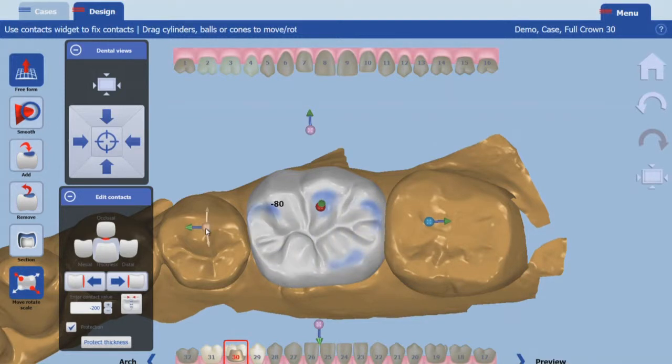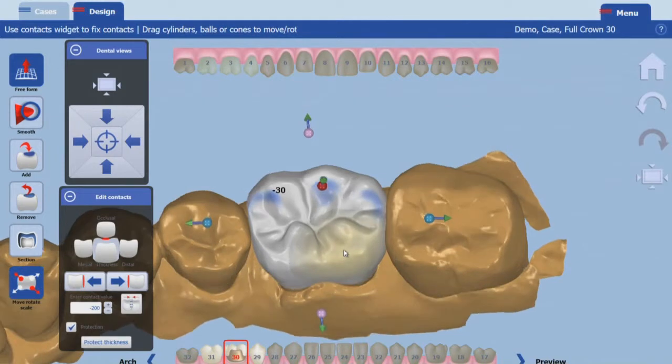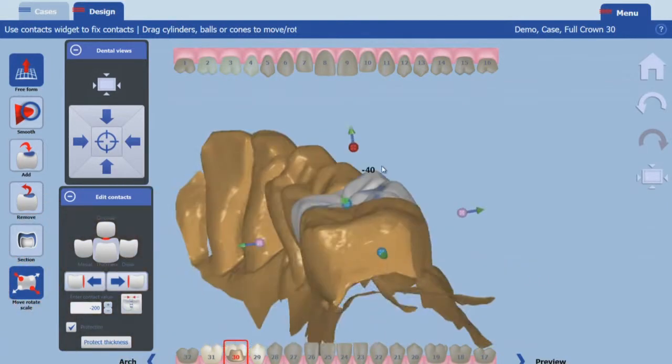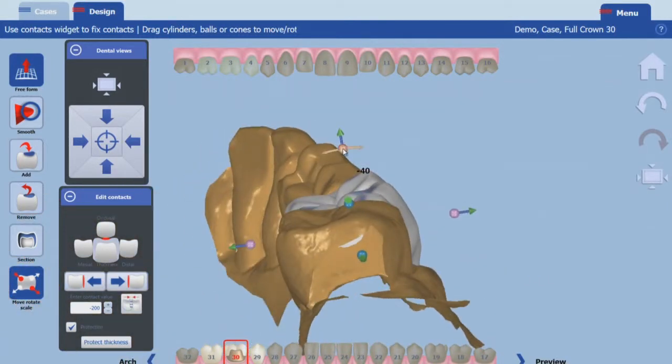By clicking and holding the cursor on the spheres, you can rotate the crown in that direction. The rotation is view dependent. To rotate the proposal mesial to distal, view from the lingual or buccal sides. To rotate the proposal buccal or lingual, view from the mesial or distal sides. You should do these bigger changes to the crown at the beginning, before finalizing the design.